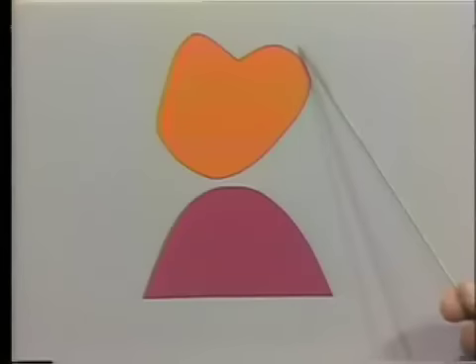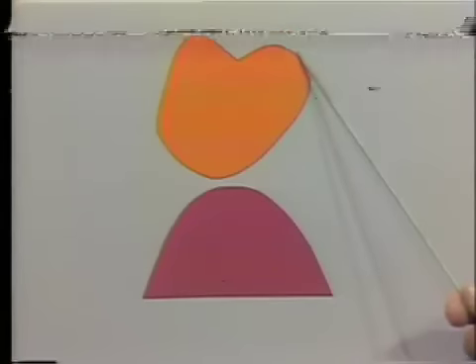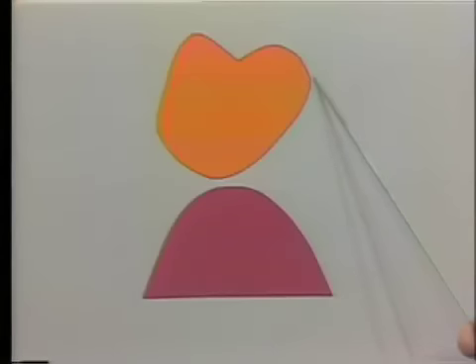On the lingual surface, where aesthetics are not at all important, the change takes place at about the junction of the occlusal and middle third of the tooth, and the lingual surface of the Pontic is swung right in to meet the other above the crest of the alveolus in this situation here. This, of course, helps in opening the embrasures, both the lingual embrasure and the proximal embrasures on the lingual surface, and gives much better access in here for cleansing of the Pontic itself and stimulation of the soft tissue in this region here.